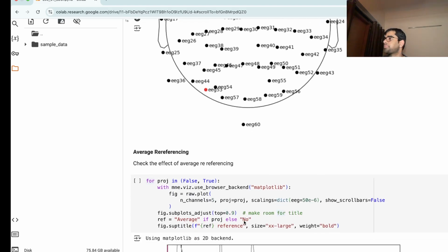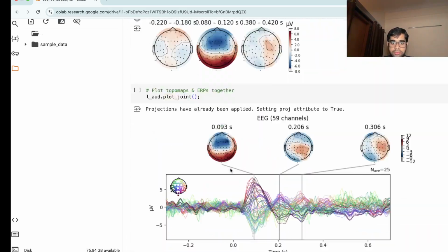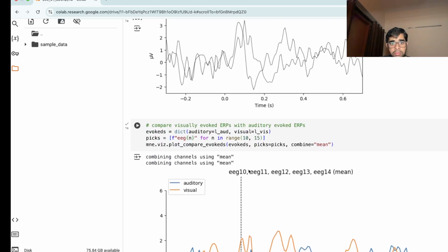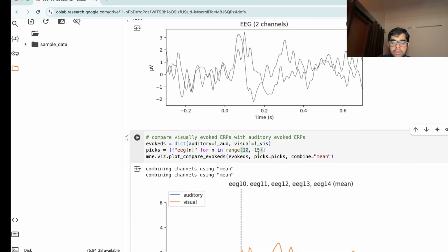So you're saying if we had chosen electrodes from 44 to 49, we would see it? Correct. If we chose these, yes, correct. You can try. We can select also. Can you please tell the electrode name numbers? It's 44, 45, 46, 47, 48, 49, 50. 45 to 50 I can write, right? Okay, let's see.